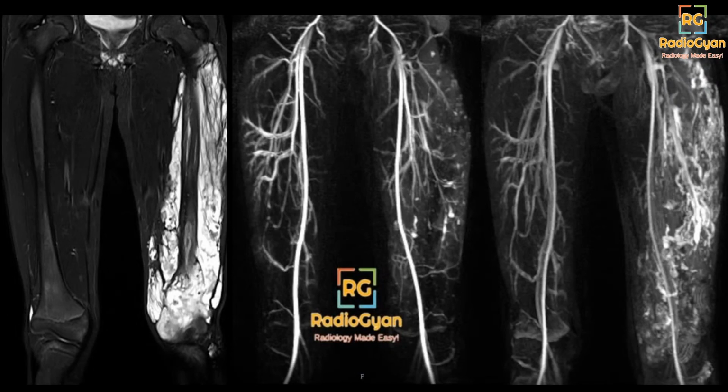Moving on to the next case. So again, this is a water-sensitive coronal sequence. The first image. The second image is an early phase of a contrast study, and this is a delayed phase.